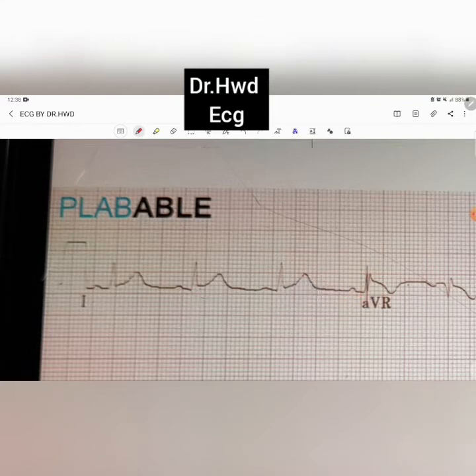You're not thinking heart blocks. The next thing is to look at the QRS complex. Now let's look at the QRS complex. See, this is your baseline. There is a shift from baseline of the ST. So there is an elevation, right? This is your baseline, right? This is elevated. So this is your ST elevation, right? In lead 1, we're seeing ST elevations, right?